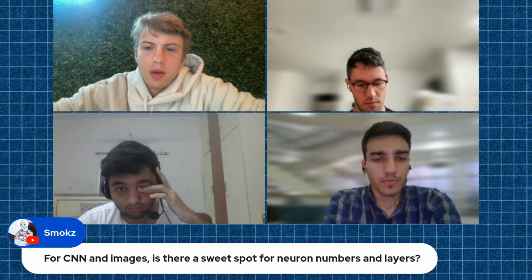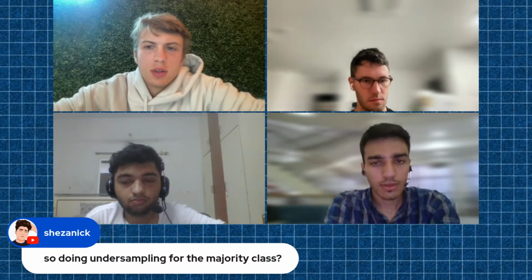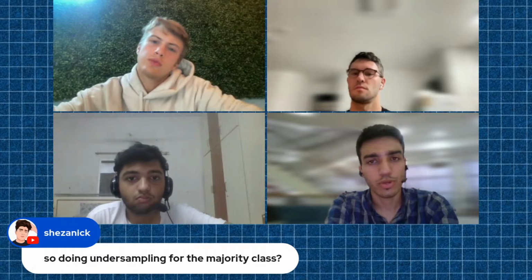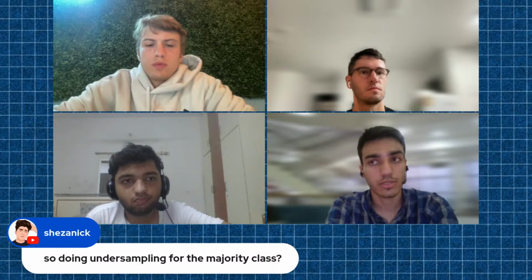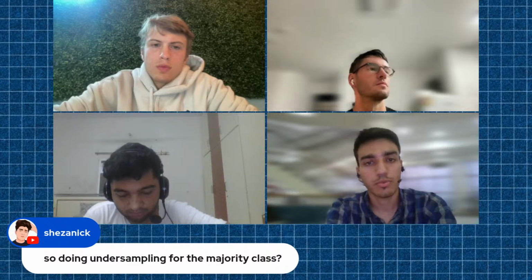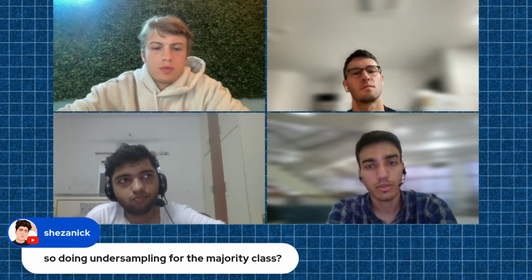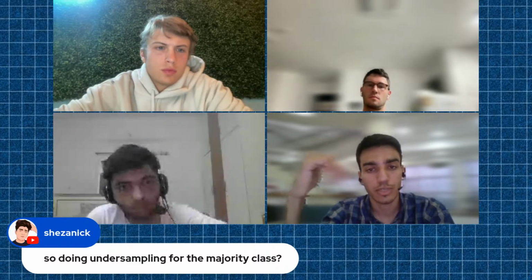Another question was, could we solve the bias by doing undersampling for the majority class? Yeah, that is something you could do. Usually it's not a very good way to do it, but if you have lots of examples, say 10,000 images in one class and 15,000 in the second class, you can throw away some of the information from the majority class. But in the problem we are looking at right now, we have so few examples that throwing away information won't be fruitful. So maybe the way to go about it would be to oversample the minority class instead of undersampling the majority class.